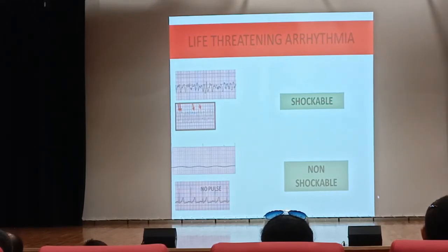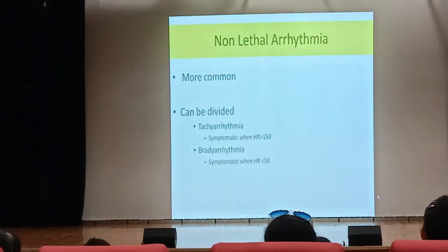So this is very, very important, and that's why you must assess the patient first before looking at the rhythm. Because if you look at this rhythm, you will say it's a normal sinus rhythm. But if the patient does not have a pulse, this becomes pulseless electrical activity.